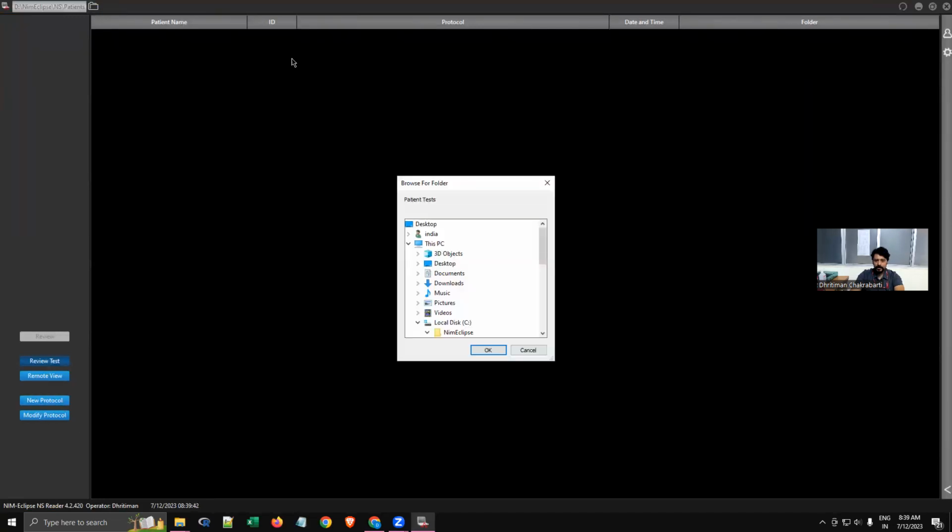Okay, it is not coming as a bar here. It should ideally come. But let's just, okay, in this, you won't be able to run the protocol. No? It won't allow you to run. Yeah, that's one problem. So running the protocol and all, you can see in the machine itself. So you can do it there. For now, I think it is clear how to set up the protocol. I think it will be beneficial for the residents as an initial introduction into setting up the machine for your intraoperative neuromonitoring. Okay, thank you and have a good day.